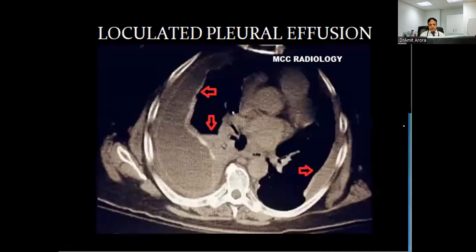Apart from this, let us discuss loculated effusion. Sometimes the fluid could be inflammatory or infected, as in tuberculosis, and it starts collecting as a thick fluid. Sometimes it could be blood if it has clotted. So it is thick and not gravity dependent. It gets loculated, or localized to a part. You can see these kinds of things, as in split pleura.